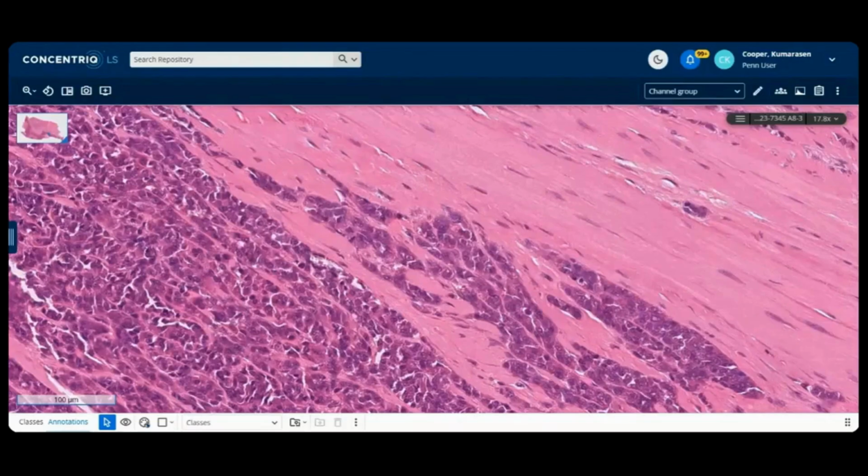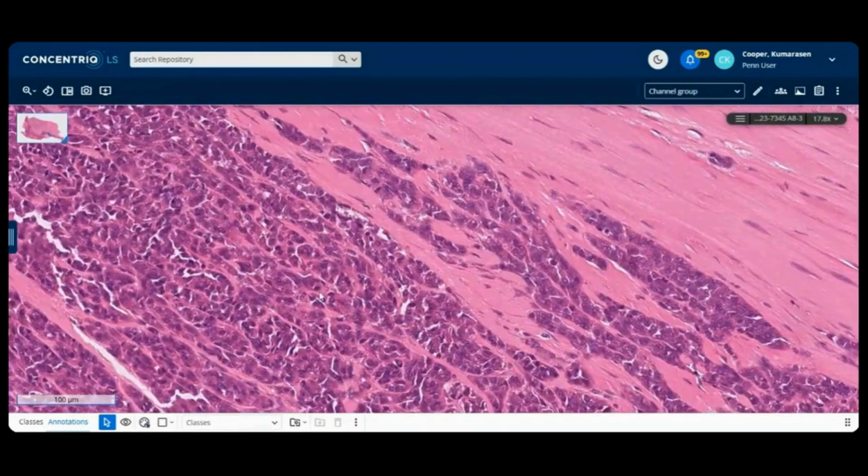You want an actin or a calponin. I like both those markers for myepithelial. Desmin can be very focal, and H-caldesmon less often. So the muscle markers are negative, but we did say melanoma, so the S100 is positive. S100 is positive. So we'll go with that.